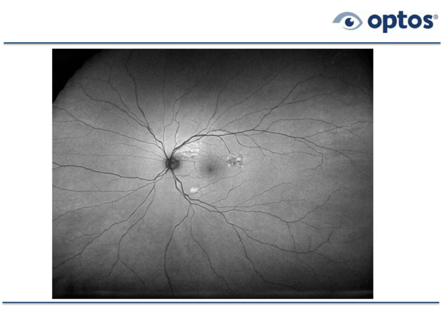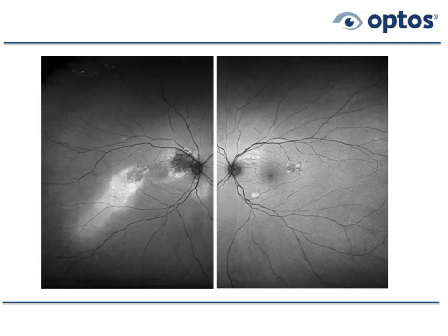And if we look at this a slightly different way, we can compare the images, the right versus the left eye. Obviously, this patient has more of a problem in the right eye. Acuities are still pretty good, 20/20 minus. Left eye is 20/20 plus. Fovea is not involved. So central serous doesn't always affect the macula or the fovea. Patients can actually have good visual acuity.